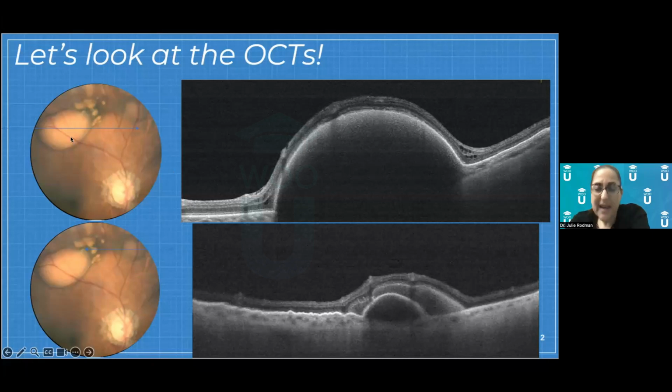So we've established now that this is a pigment epithelial detachment. And I don't know if you can see it, I have an arrow here coursing through the second lesion. And for the second lesion, if we do the same kind of thought process, we find our RPE, we trace it over, we hit some bumps in the road here. These little bumps in the road are these tiny little spots, and those are drusen, okay? And then if you keep coursing over it, we come to another PED.